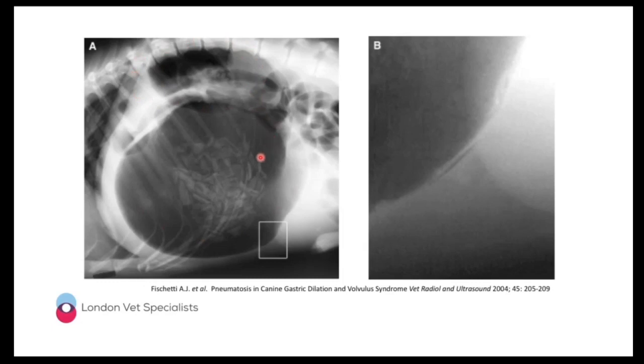As well as that, we've got some strange gastric contents. So this patient has eaten a whole bunch of mineralized material before twisting the stomach. We've got this paralytic ileus that we talked about. So we've got a single population of small bowel that is moderately dilated and filled with gas. And then if we zoom in on the stomach wall, we can see that we've got a little linear band of gas within the stomach wall, and that is compatible with a gastric pneumatosis.